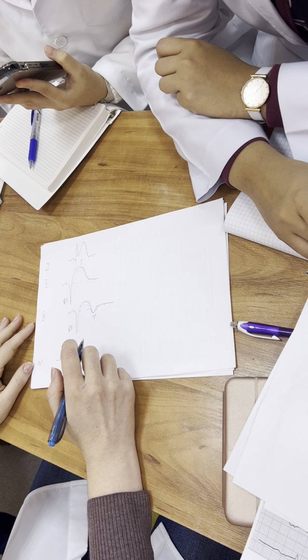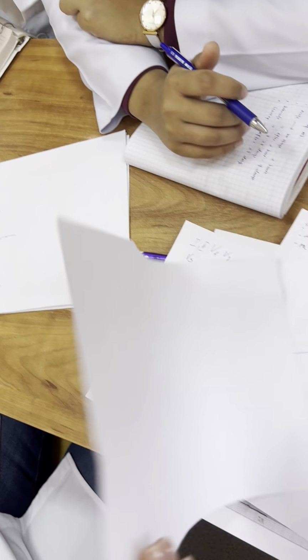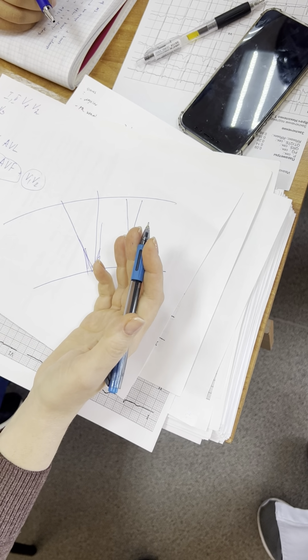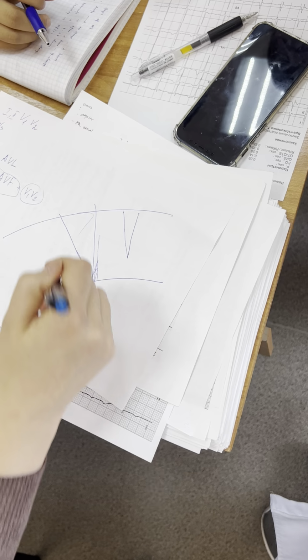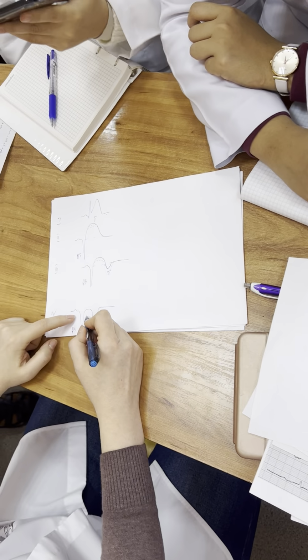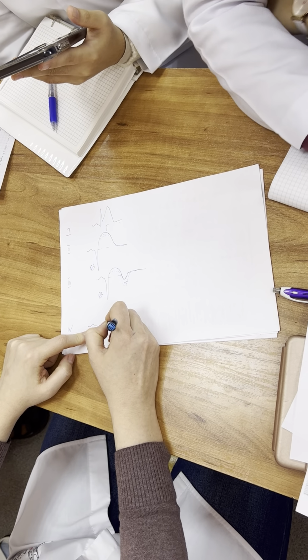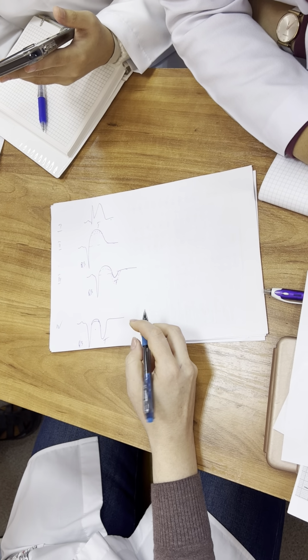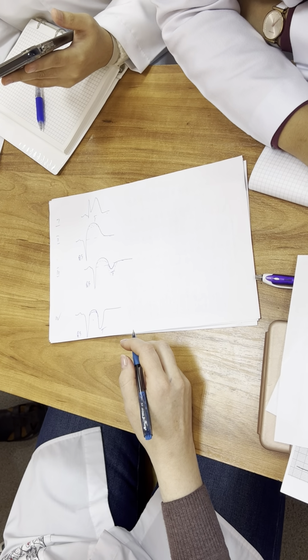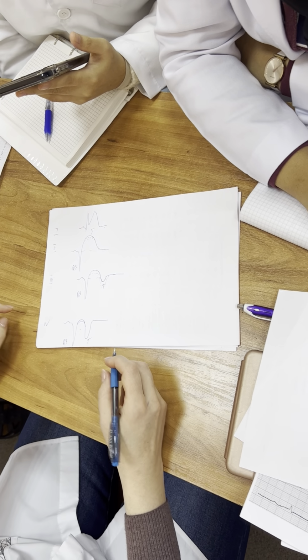Maybe another situation: transmural MI can be complicated by aneurysm. Because in this place, in this necrosis, myocardium muscle is already absent. So here there can be development of aneurysm. How can we understand it by ECG? We have start of scarring stage, but ST stays in this situation, about 1 millimeter elevation, but constant elevation from day to day without any dynamic in scarring stage. It's a marker of aneurysm. Understood?